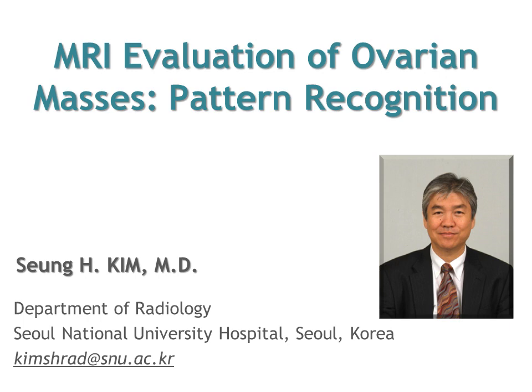In this session, I would like to share my experience of MRI evaluation of ovarian masses with pattern recognition approach.